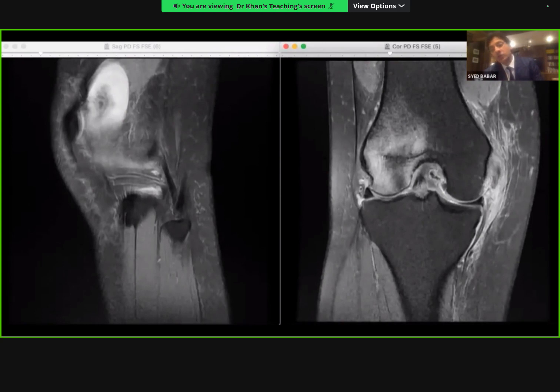And imagine if the force was coming from the lateral to the medial side, you'd get bone bruising here, but you will disrupt the MCL. Because remember, when the two bones are like this, if the force comes from outside, it'll open up the other side of the joint. When this side of the joint opens up, you damage your MCL. So that's the classic lateral to medial force vector acting on the knee joint.